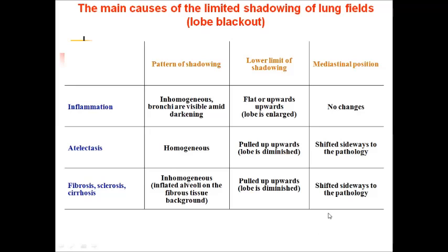And mediastinal position, the same changes happen as in total shadow of lung fields. Inflammation causes no changes, atelectasis shifts the mediastinum sideways to the pathology, and fibrosis also pulls the mediastinum shadow sideways to the pathology.